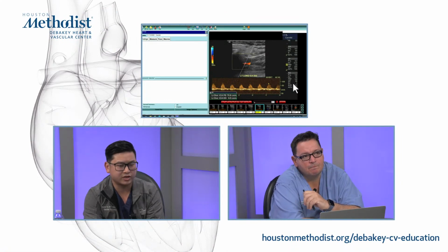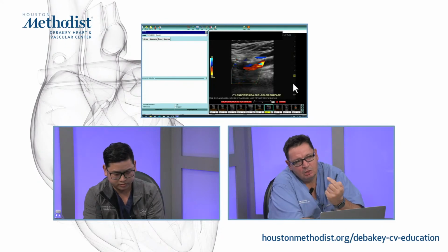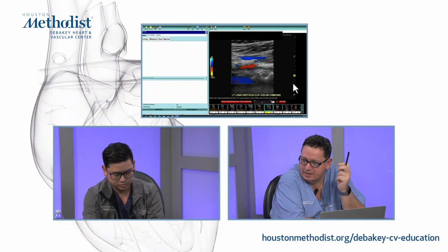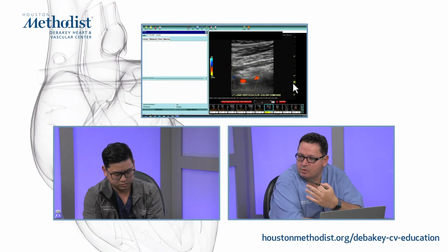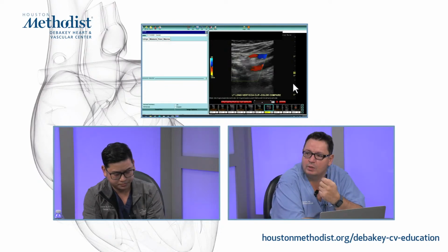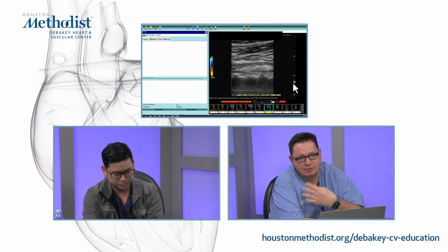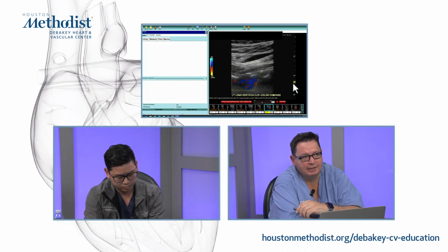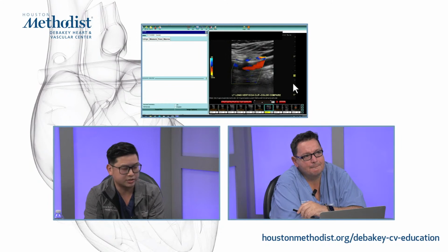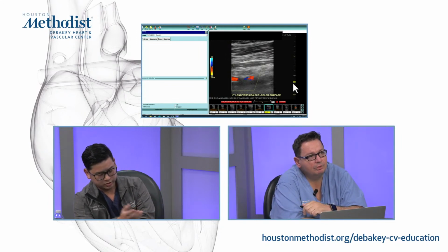Yeah, because even in high-grade stenosis of the ICA, you would have an elevated diastole. The only thing is, I just had another case today where everything was high resistance. Sometimes with chronic hypertension you're going to see a high resistance signal throughout every vessel, but that's a different case. You would need to see that every vessel has that high resistance. Mm-hmm. Oh yeah, that's true, because it's more central. It's likely a heart issue. Very good. And your vert? Antegrade vert.